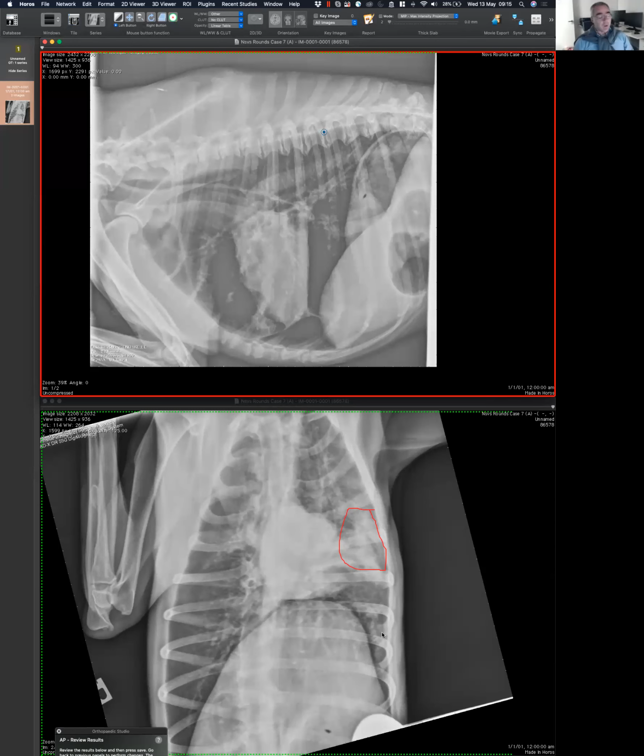So there are many interesting things. Hopefully I can come back and I remember everything from what you are saying. This is a DV projection, and something that we need to be aware of is that the lung doesn't really, what I'm going to say may sound silly, but it's probably not. So the lung doesn't really stop here. This is ventral, and that's the liver and diaphragm. Dorsally, so that's this border. But superimposed over that liver, there's a lot of lung. I would say almost all of the caudal lungs are sitting here. Make sense? So if we talk about caudal, I would just be referring to this.